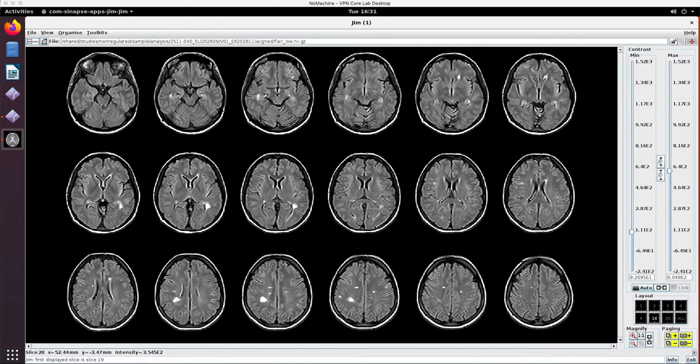And so what we're seeing on these images is generally fluid shift contents, although many other biological properties can also alter the T2 properties. Usually what we're looking for is that lengthening, though, that's going to be associated with this brightness on a FLAIR image, or on a T2 weighted image. The things that contribute to these T2 lesions are extremely varied. They can be inflammation, demyelination, gliosis, edema, axonal loss. All these different things will show up as a bright T2 lesion on FLAIR.